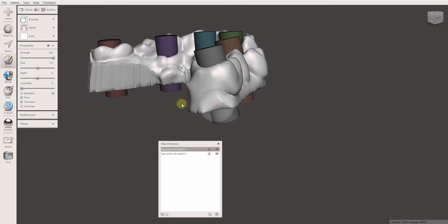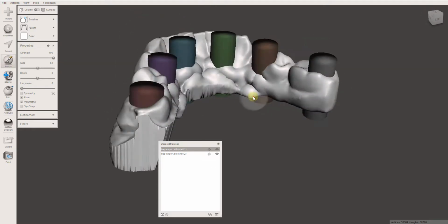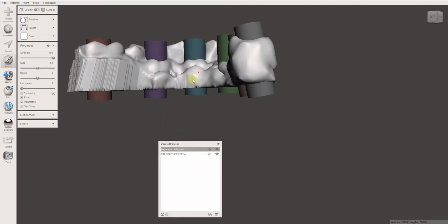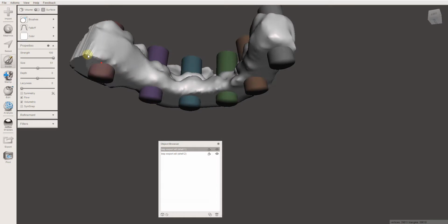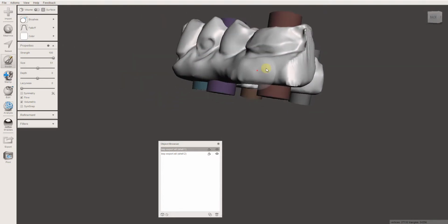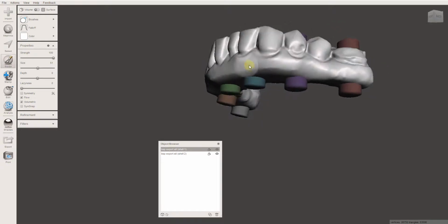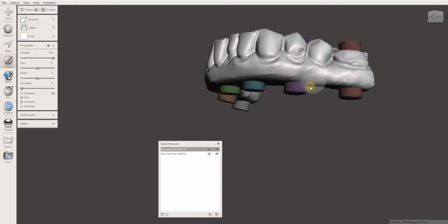You can always 3D print this and then pick up a burr or something, but it's kind of sloppy. This is a way to try to have it all done digitally, so there's less you have to do after you print this. I'm just going around to all these different areas, and this is the shrink smooth tool.